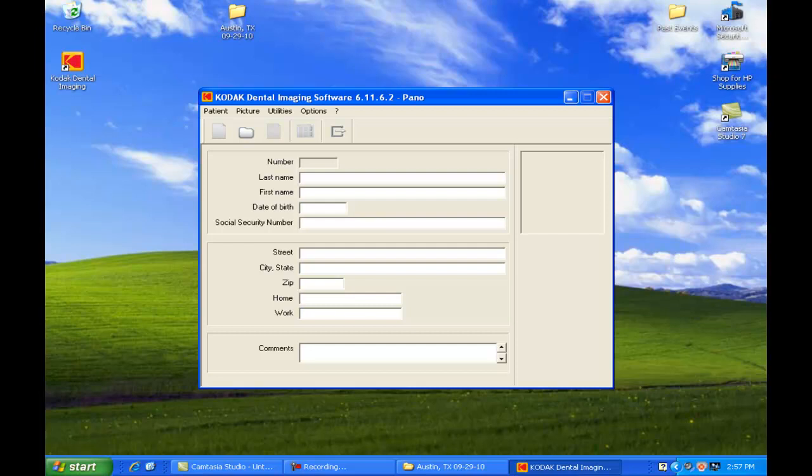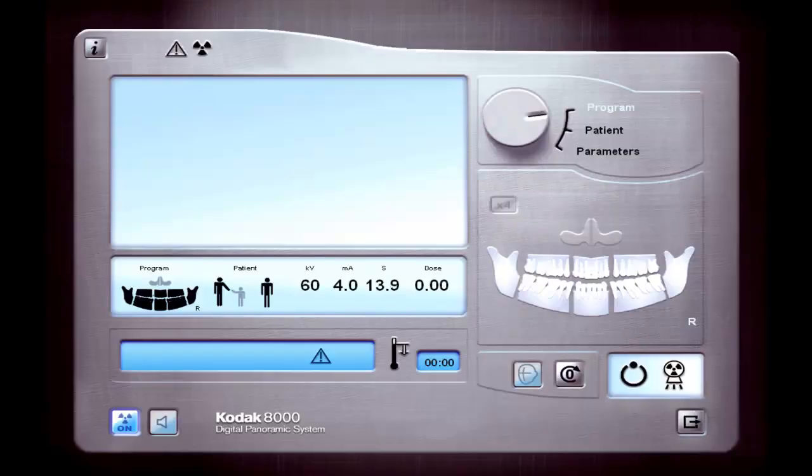This will now come to this big black screen. And then what you need to do is scroll up here to this icon which says new panoramic image. Some look at it and say the smiley face. Some people say it looks like a printer keyboard or a computer keyboard, however you want to look at it. But this icon right here, click on that, and that will now bring you to this screen.